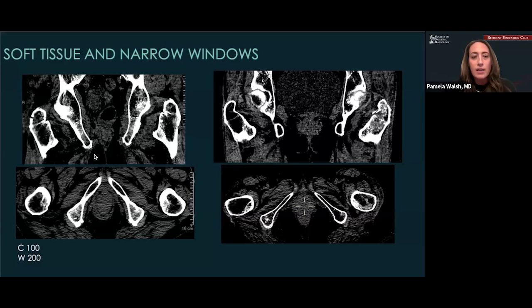So we look at our negative case over here, we see that medullary fat looks pretty similar. And then when we look at this side, all this density is going to correspond to the fracture and some edema and hemorrhage, and that increased density should signal to us that there's occult intertrochanteric extension.